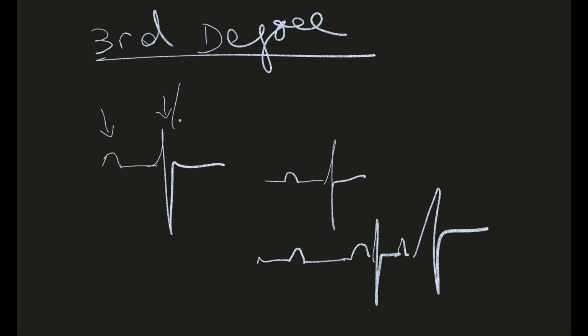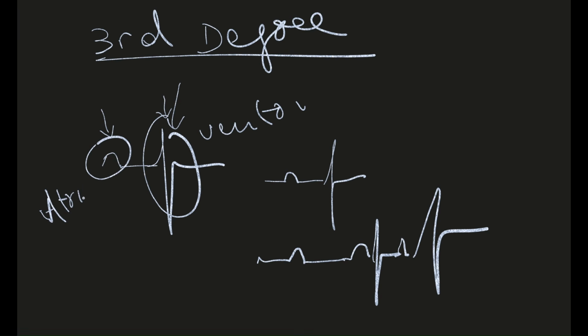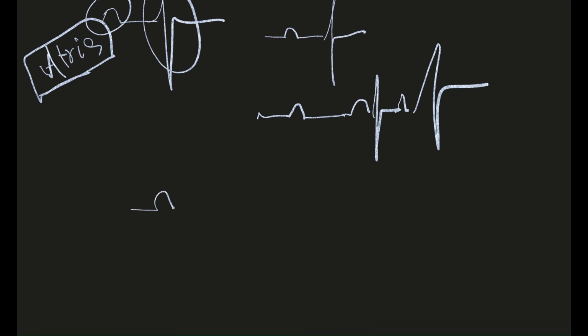In short, the QRS complex is from the beating of the ventricles, and the P wave is from the atria. The atria are sending their own impulses in the form of P waves that are recorded over the ECG paper independently, irrespective of any correlation between P and QRS complex. Normally, you see there is a P wave, soon after that a QRS complex, then a T wave.